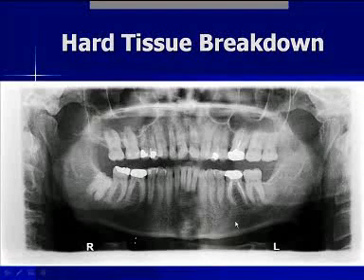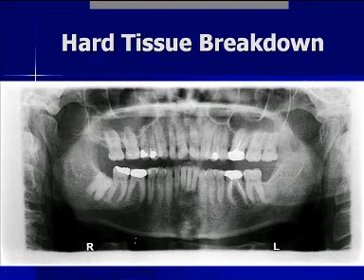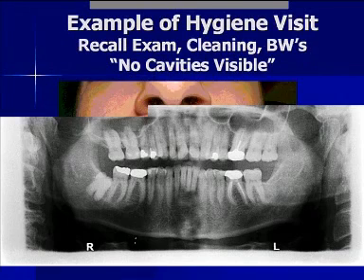This area is heavier than the right side. So is it related? It may very well be.